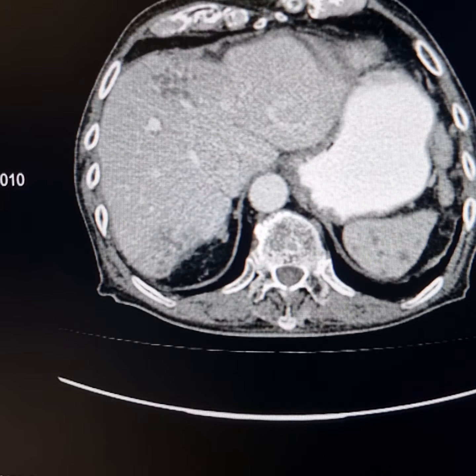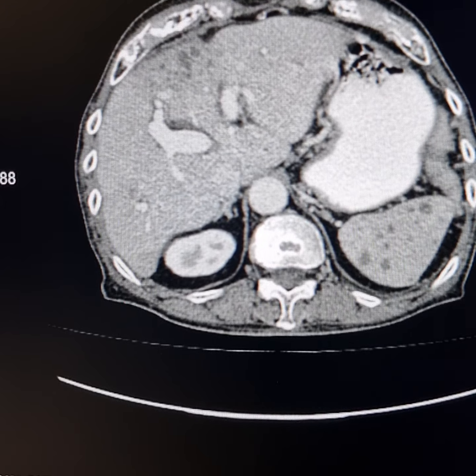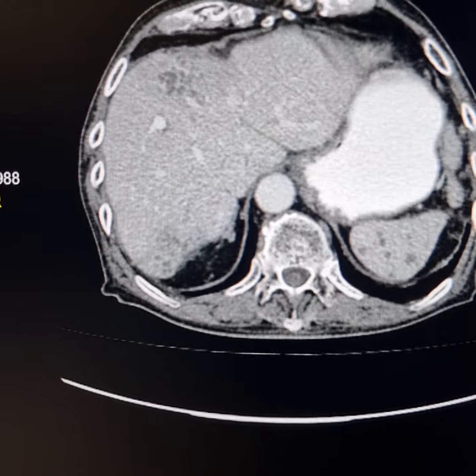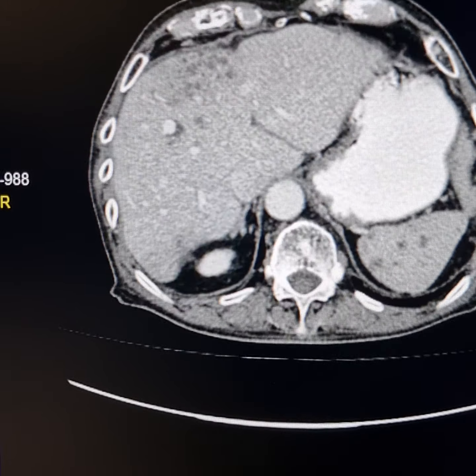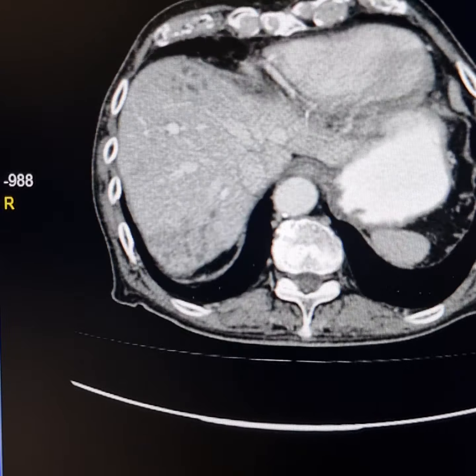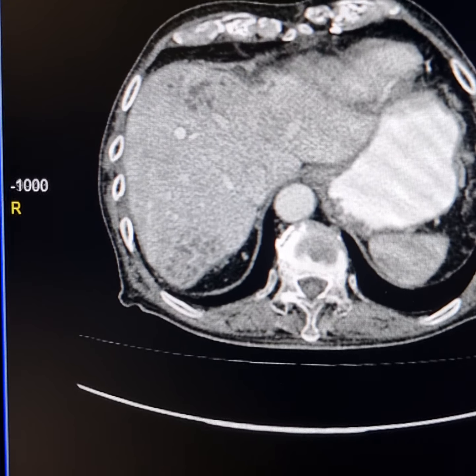Now just see, these are the evolving abscesses here. These aggregates of stippled lucencies and change in the altered texture along these clusters of cystic lesions. These are the evolving abscesses, quite typical of them.